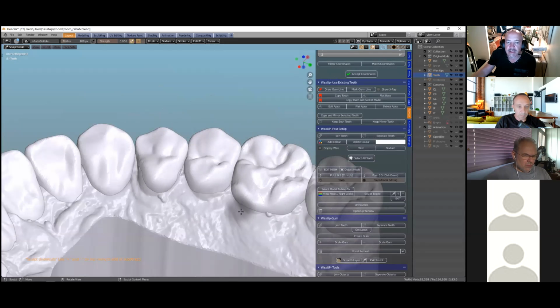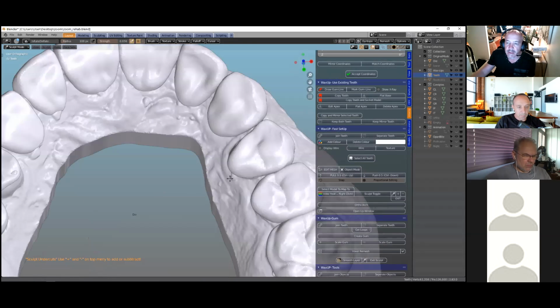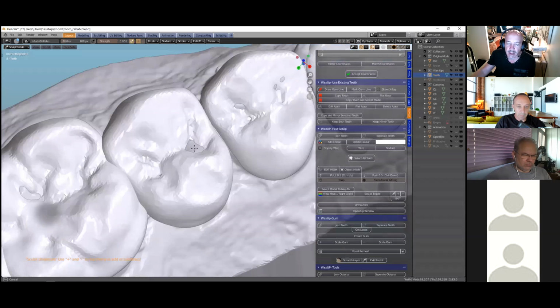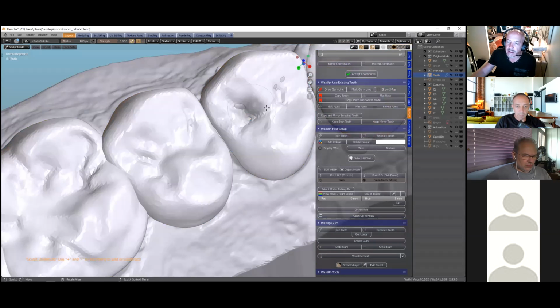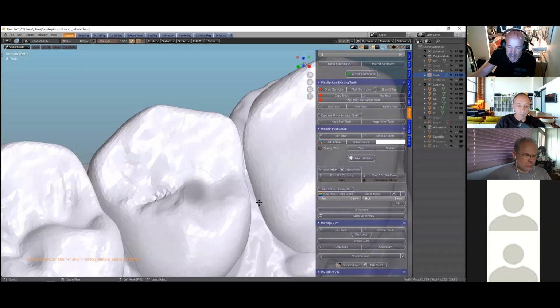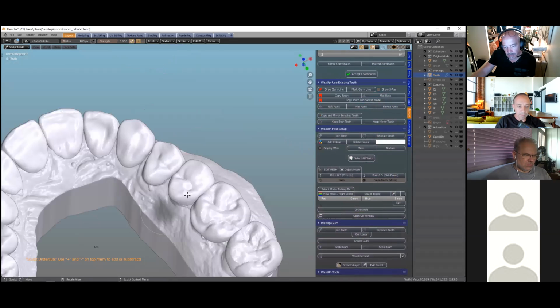And then using the articulator, we are able then to grind in the bite. And I'd like to actually do that in a separate Zoom meeting, how we're going to grind in the bite. So I'm toggling, right click, and I can see there are some red zones over here. And I can quickly just sculpt them and toggle. Sculpt and toggle. So I don't want to see red because red is too thin.